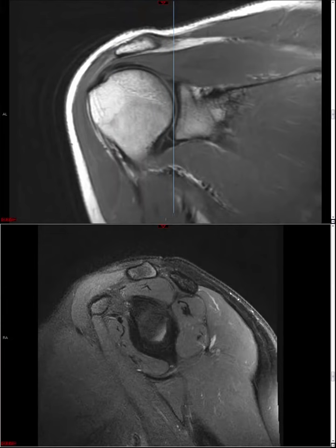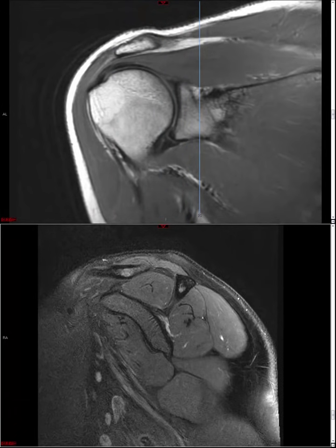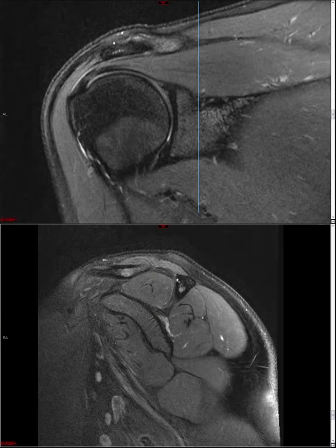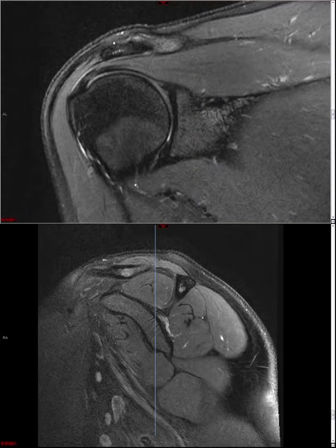And they used to talk about, with regards to supraspinatus, how much the muscle belly fills the so-called supraspinous fossa, as shown here, as a means of determining if there's atrophy or not. Unfortunately, there is a potential pitfall with that. For example, let's say you have an acute supraspinatus tendon tear, but there's a lot of retraction.